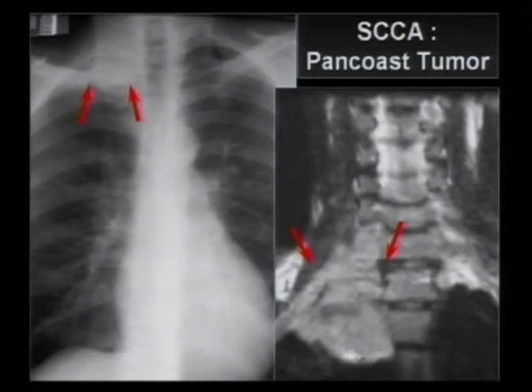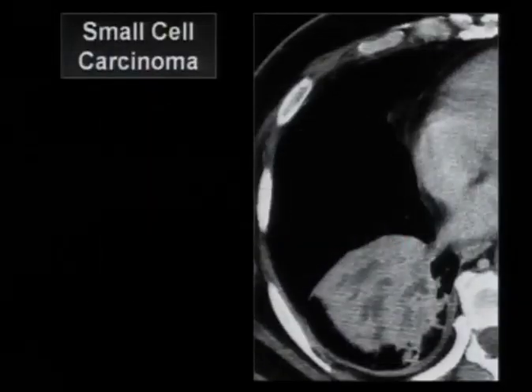On the MRI scan, you can see that this lesion is actually invading through the top of the chest wall, which is right about here, up into the tissues superior to the lung apex, causing Horner syndrome. Part of that syndrome is ipsilateral anhidrosis and miosis due to the impact on the sympathetic ganglia. And often you'll have some upper extremity weakness as well when the brachial plexus is involved, and this patient definitely had that. We'll see that this makes you T4. If this is a lung carcinoma that you come across and you're staging it, once you've got brachial plexus involvement, it's a T4 lesion.